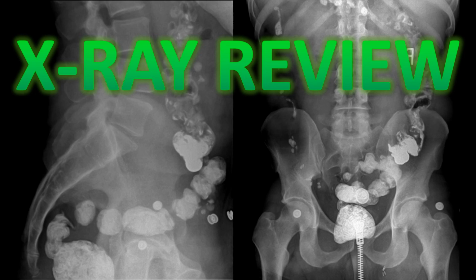All right, and hopefully now you know what residual contrast looks like on an X-ray from a previous lower GI exam.